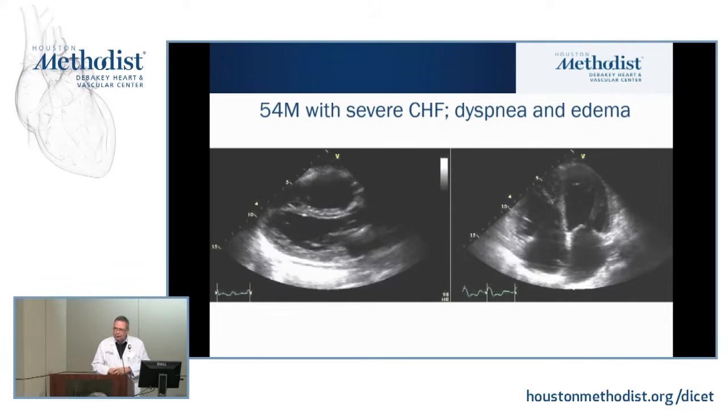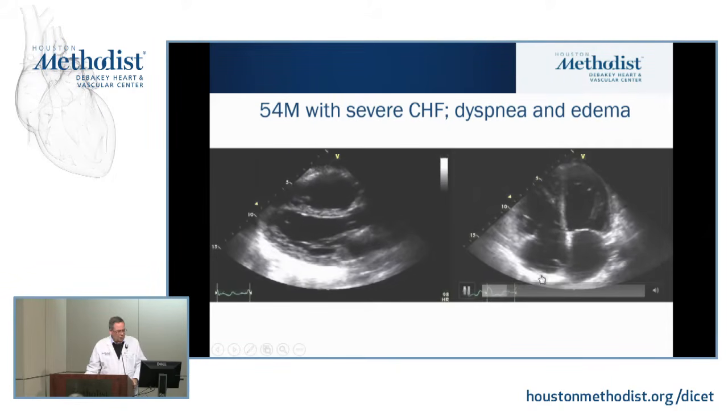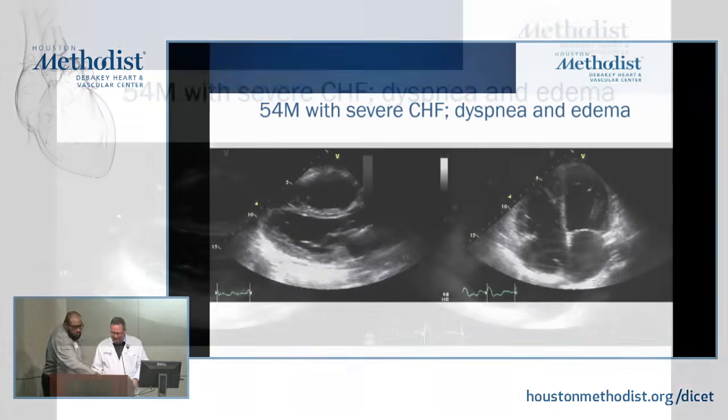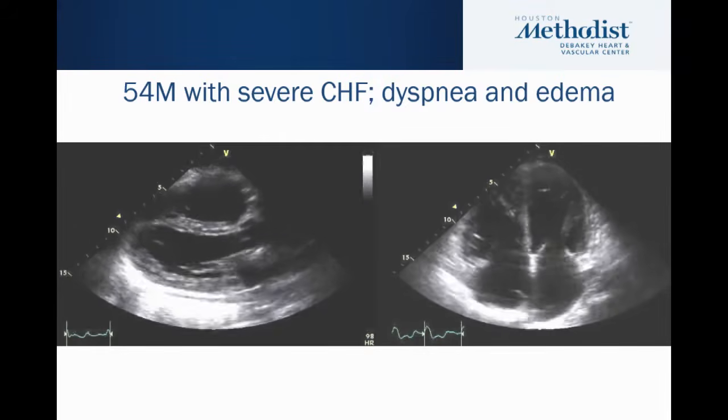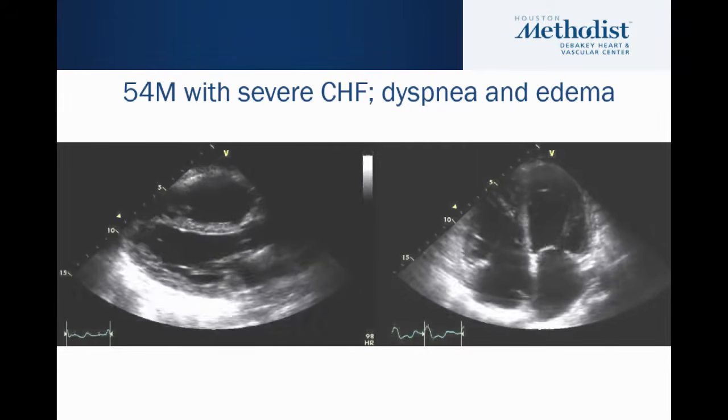Okay, what about this one? This guy is very sick. Look at the tricuspid valve. Whoa, what happened there?